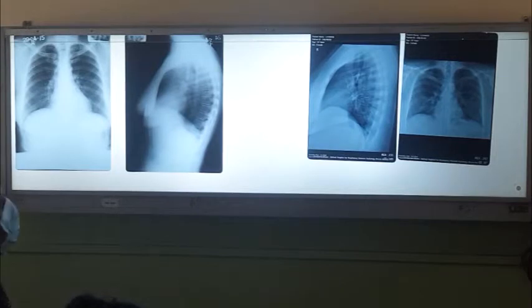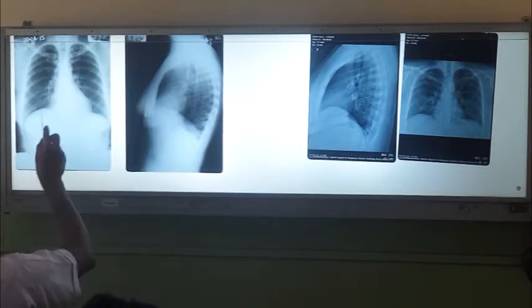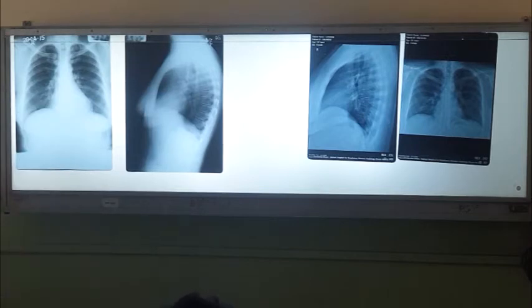So after looking at dates and everything, there are three things that you have to look for before reading the X-ray. Don't go and try to read the X-ray without checking all these things, right? One is whether it has been done with the correct positioning. If you keep the patient correctly like this, these spinous processes which are here should be in between the clavicles, right? The clavicular heads. So it's a well-centered film, right?